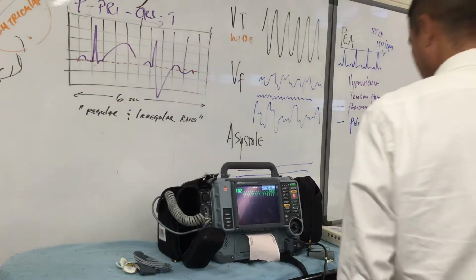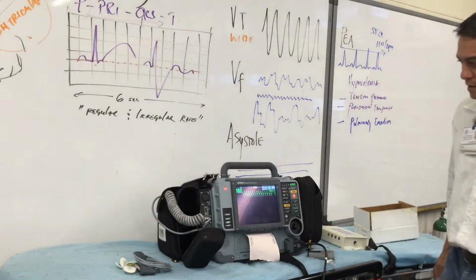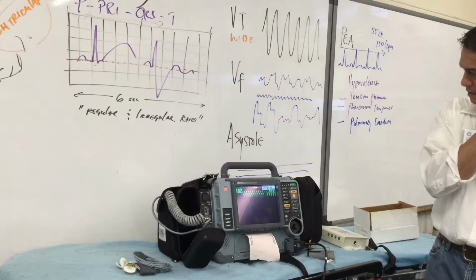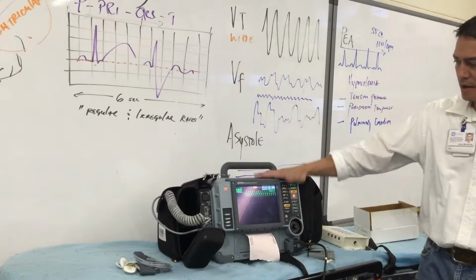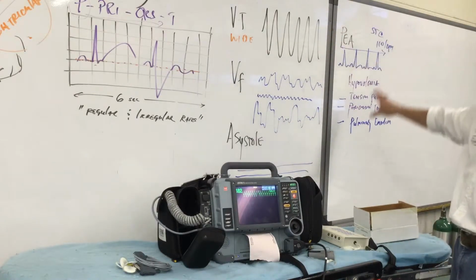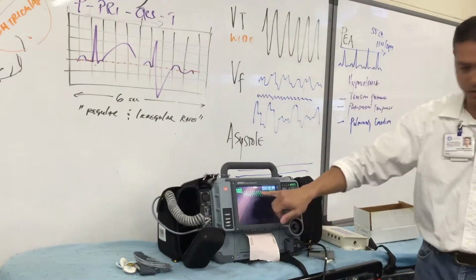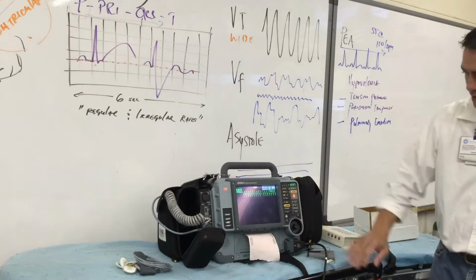So let's end this basic EKG course with a few other rhythms that we'll see on the EKG. Right now we're going to finish up with the cardiac arrest setting. So your patient is in a wide complex rhythm. It's hard to really tell from far away, but you can see here.